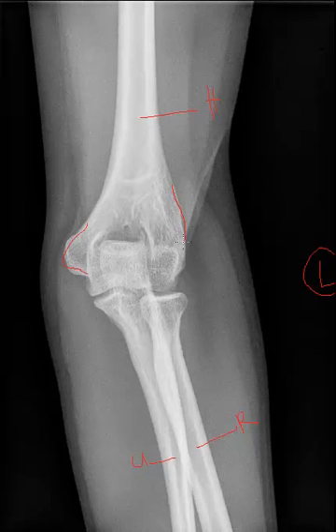So quickly, I'm just going to give you a little acronym to remember the order of ossification center appearance, and it actually uses the letters CRITOE. C-R-I-T-O-E. And this is the order of appearance of the secondary ossification centers of the elbow, starting with the capitulum, next radial head, internal epicondyle, trochlea, olecranon, external epicondyle.